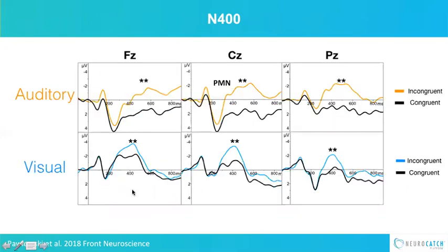So here it is. This is the N400. And let's walk through it again, flat baseline. We get an early sensory P1, N1 peak, and you can see that as you have before. And then this large extended peak. There's your N400 with this double asterisk. Now remember I told you that there's an earlier peak that's to the sound of speech. That's what's called a phonological mismatch negativity. So early on, as early as 250 milliseconds, your brain is starting to code that the word didn't match and the sound didn't match. And then later on it's saying, yeah, that's right, the meaning didn't match too.